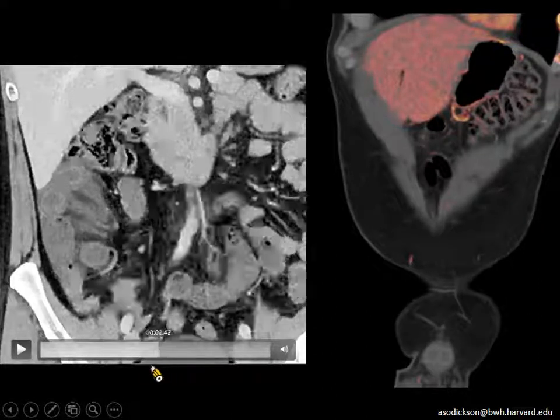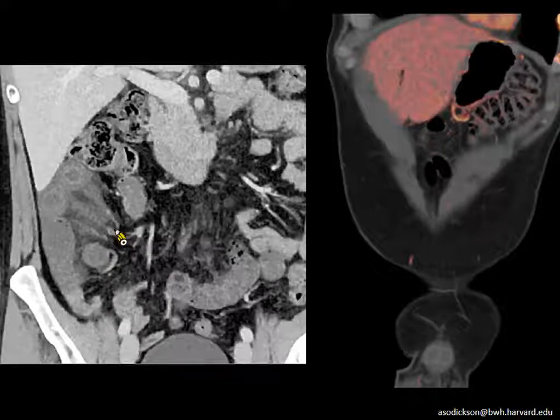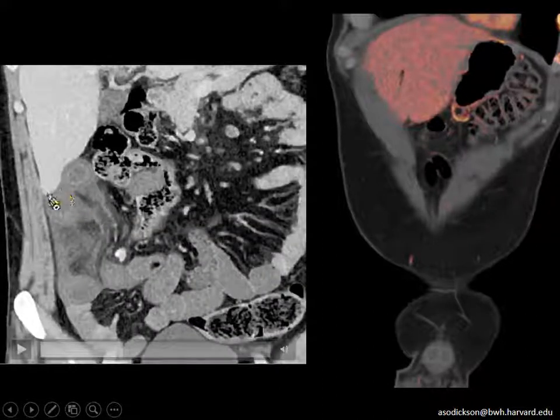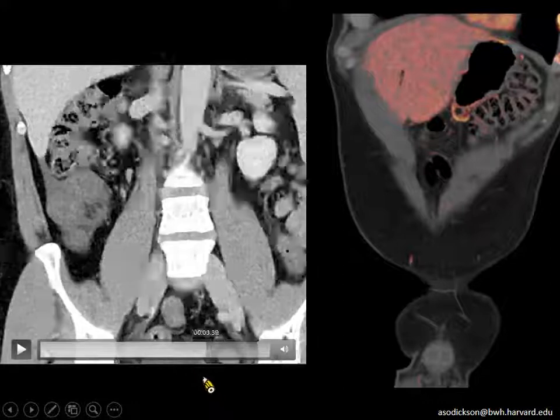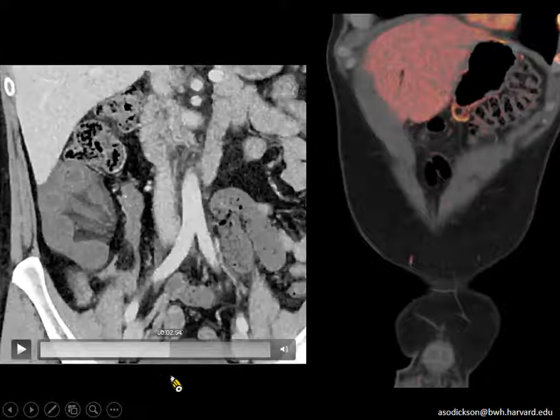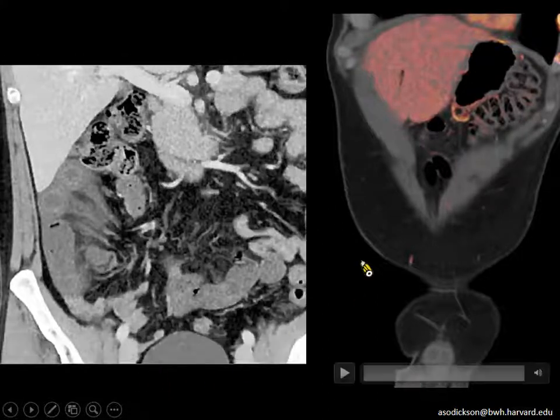which is difficult to do. You might have to take my word for this one, that there are two adjacent transition points, again, very closely positioned at the apex of those radial folds. Other features, we have, again, these very abnormally thickened small bowel loops. We have a large amount of mesenteric inflammation here, perhaps due to venous congestion, perhaps due to ischemia. This is a concerning appearance.